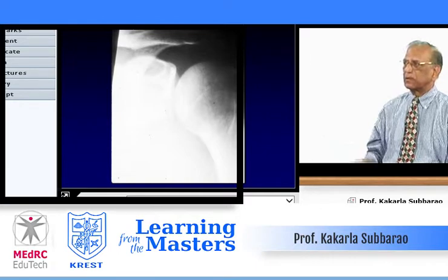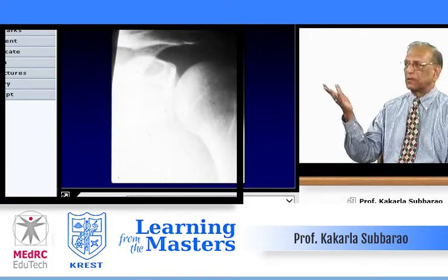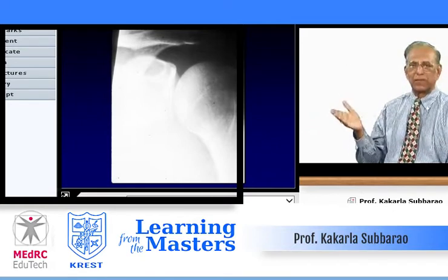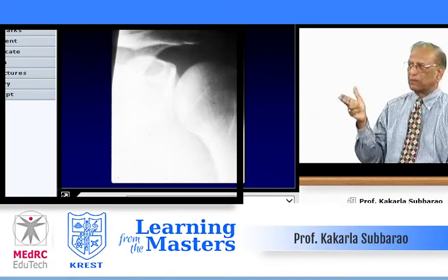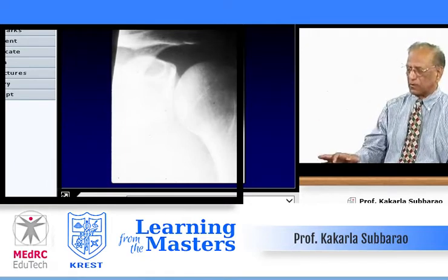These are all the preliminary screening. Another common injury is dislocation of the shoulder. Look at the loss of parallelism between the glenoid rim and the articular margin of the head of the humerus: shoulder dislocation.